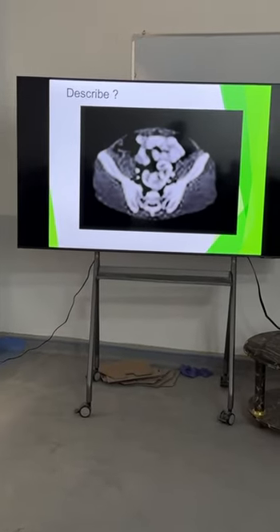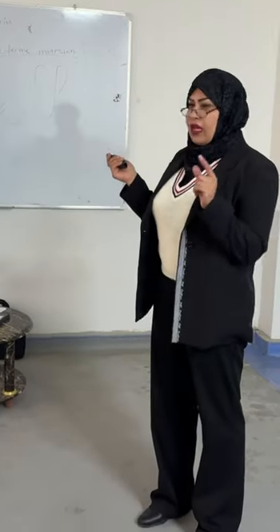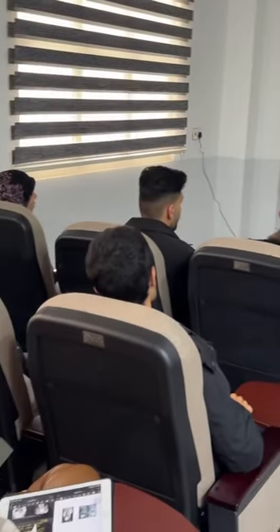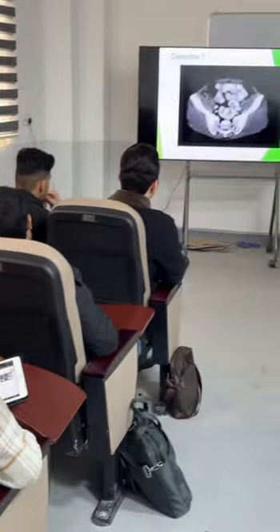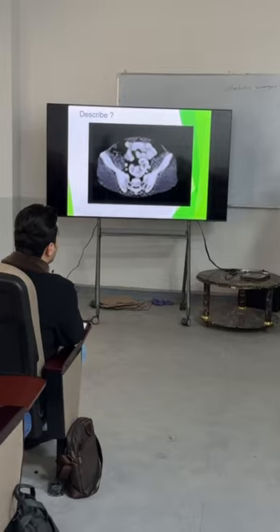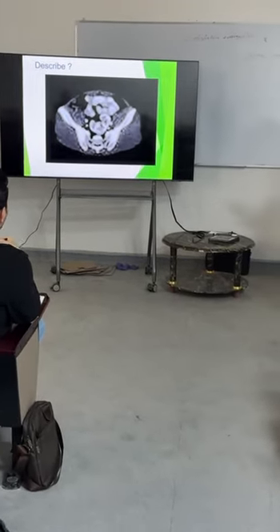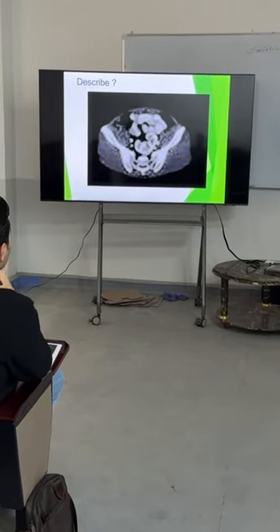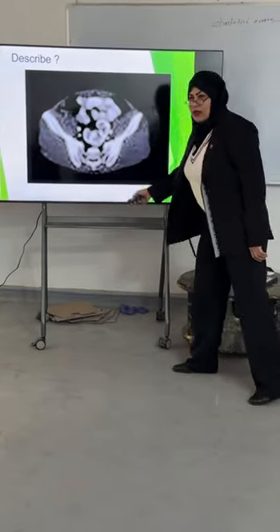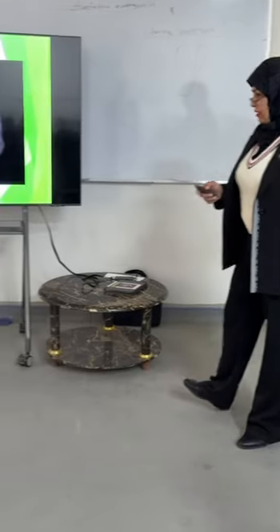What type of study is it? CT scan. Which section? Axial, excellent. At which level? What are these hyperdense structures? Iliac crest. Conclusion, I'll help you. This is a kidney inside the pelvis. So it is an ectopic pelvic kidney.